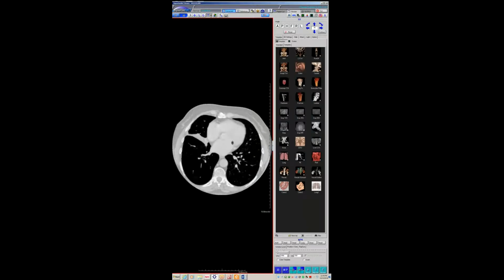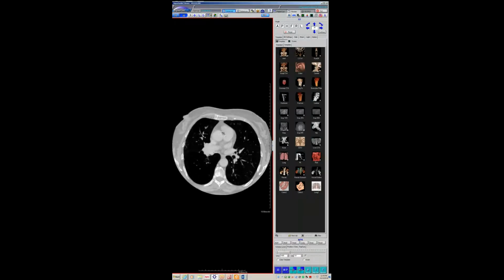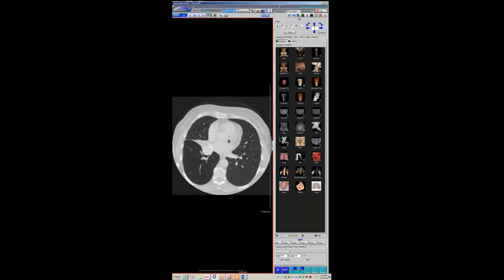Is it just taking the lateral segment? No, it looks like the whole middle lobe is involved. I mean, that's clearly calcium. It's just that the right upper lobe anterior segment is coming down along the heart, which is why you still see the right heart border.